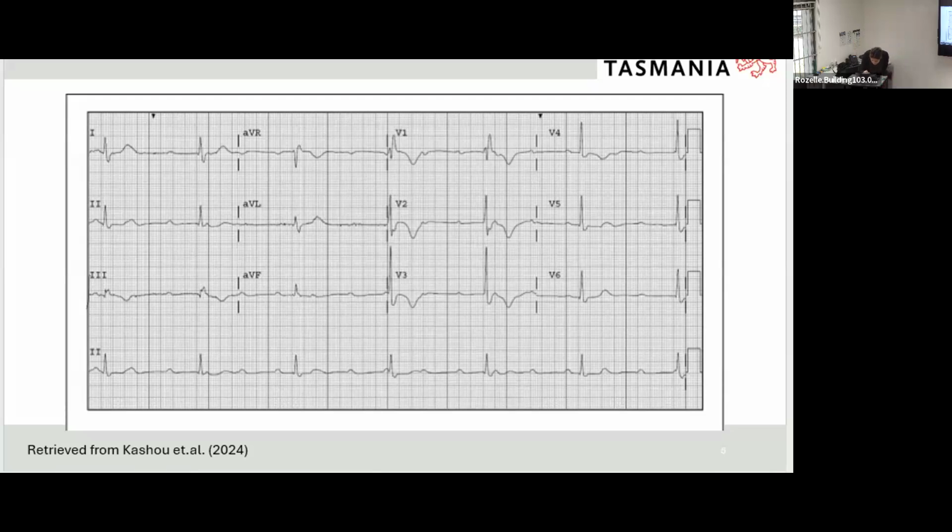So we're looking over here, so this is pretty isoelectric here. So we're pretty happy that's isoelectric there. We're about one along the lines there. If we're looking at our isoelectric line here, we're pretty happy. If we're looking at our isoelectric line here, maybe we're a little bit depressed, and maybe a little bit depressed there as well.